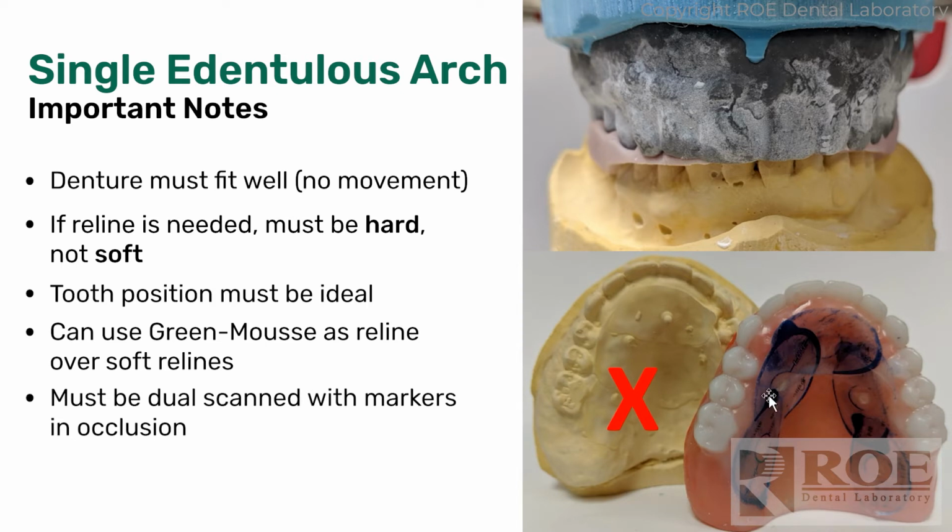And you'll stick them on the denture. You can put them anywhere except the intaglio. You can put them on the teeth, on the palate. Obviously don't put them on the occlusion because we need the patient to be able to bite. So place the stickers, and you'll perform what's called a dual scan. And this image here is just showing what we do with that dual scan.